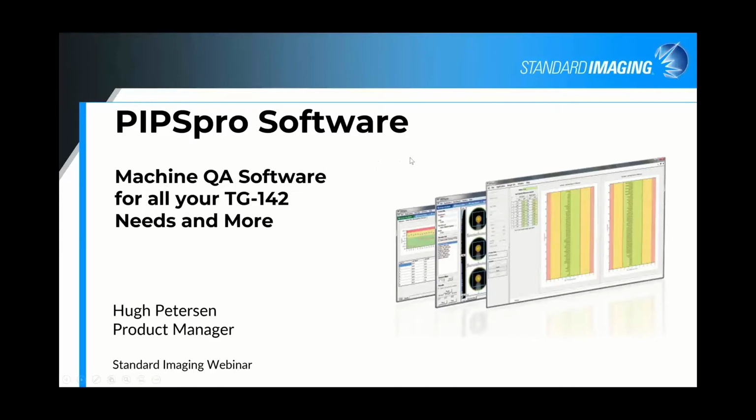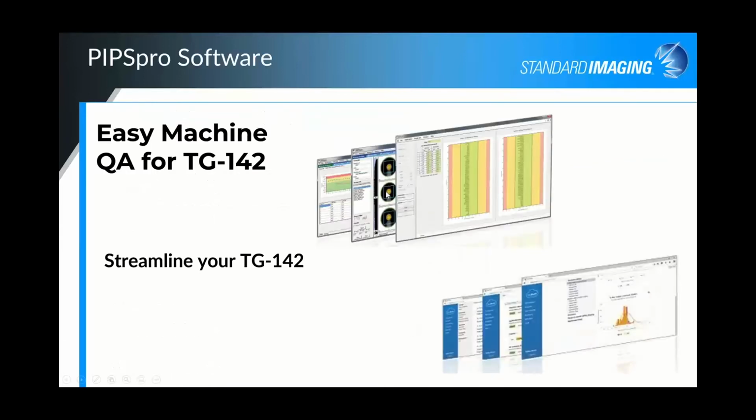Once I get my PowerPoint moving, there we go, we'll get going. So, like I said, the PIPS Pro software is designed for easy machine QA for TG-142, allowing you to streamline and modernize your test regimen for TG-142 and just for QA in general for a number of different things.